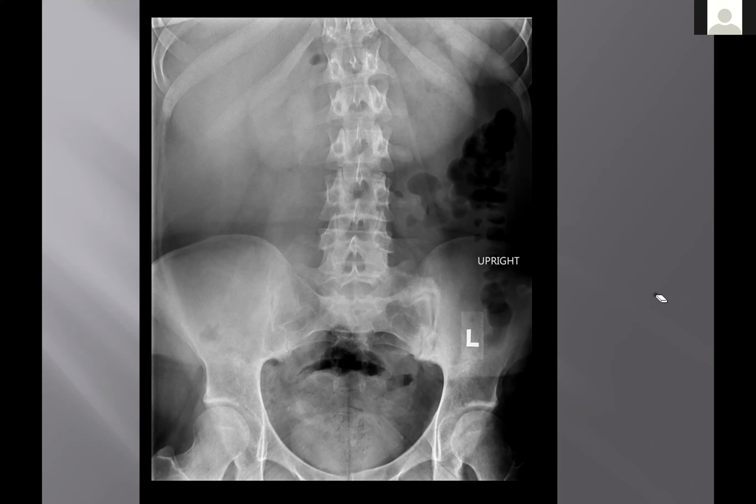Sclerotic SI. Good. So on the left SI, there appears to be some sclerosis in here. I agree. What else? Due to arthrosis. Yeah. Right here, there's a pseudo joint with sclerosis, and it's only on one side. So what would you call the finding here at L5-S1?